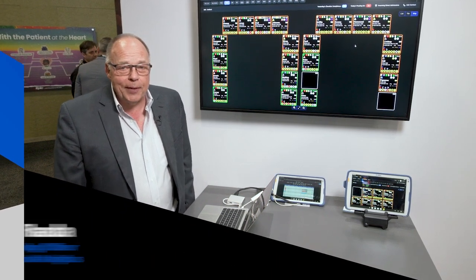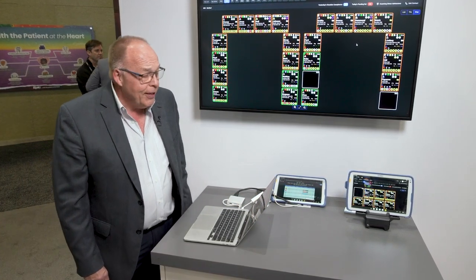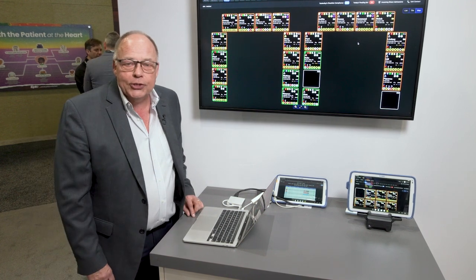Today in the Zebra booth, we're demoing a couple of our different applications. The first is a patient monitoring application called Aware. Aware's heritage is through the ICUs, where it can be very difficult to figure out what's happening to a patient by looking through an electronic medical record. It's kind of like tabbing back and forth through a nested Excel spreadsheet.